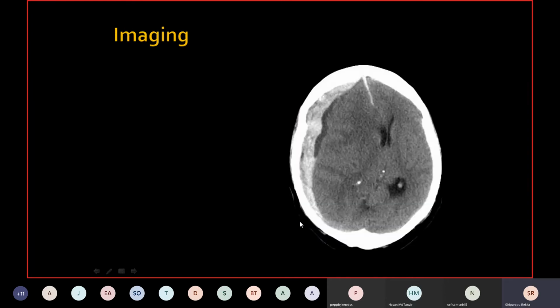And when these veins rupture, we can see subdural hemorrhages. So what is it that we see on imaging? This is a young patient and in the context of trauma, so usually overlying the convexity. Now they are again extraaxial by definition, and when we see a hematoma, these are concave inwards because remember these are occurring into the potential space.